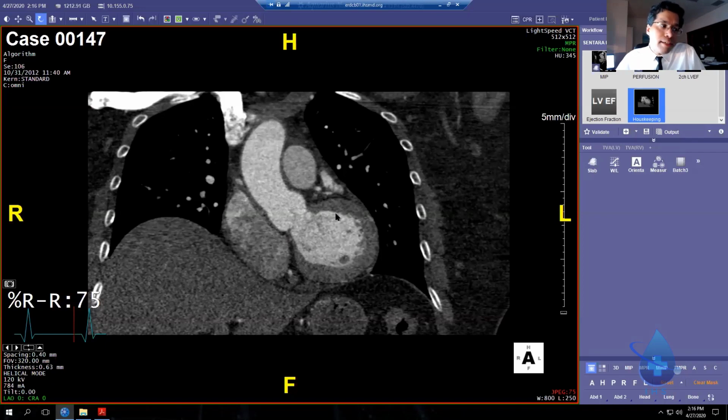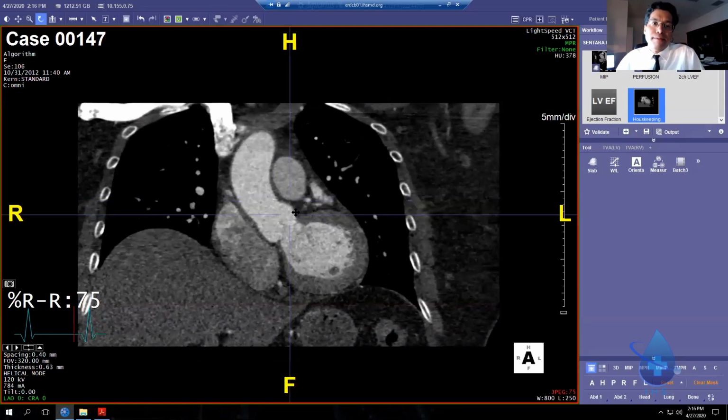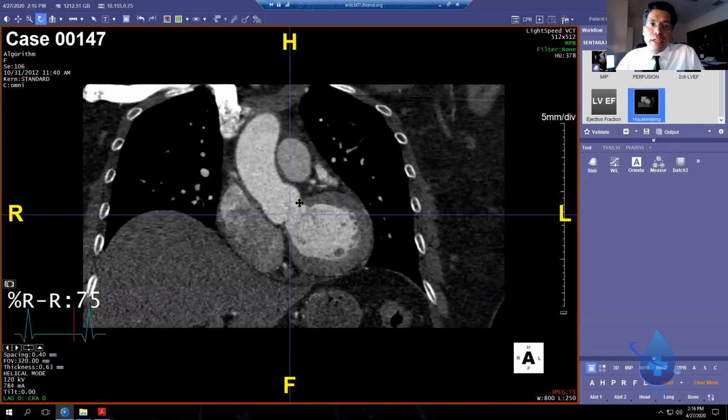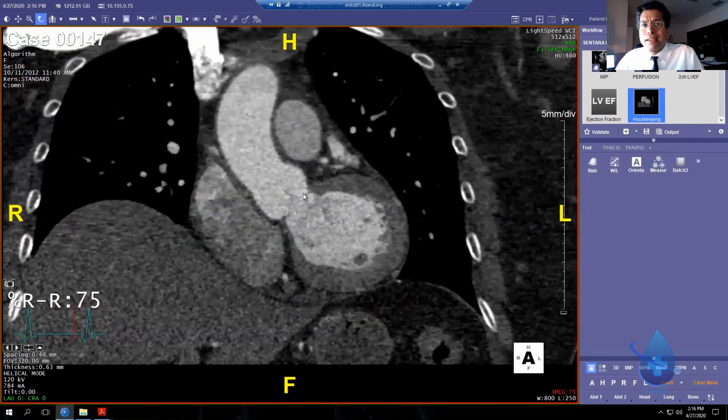Second for cardiologists. Second thing on the list now is to review for pulmonary arteries. Actually, I've got the aortic valve written here. Here's the aortic valve. The aortic valve commissures form a T that's aimed right down the center line of the aorta.